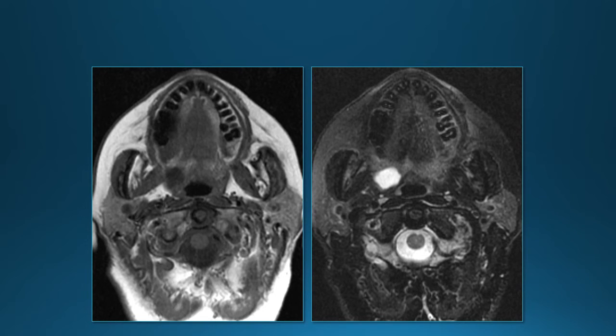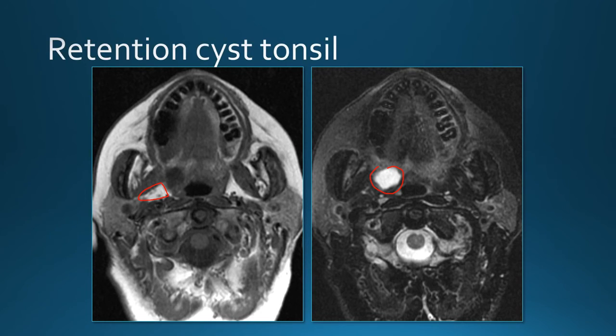This is similar with a lesion in the tonsil here. This one, the parapharyngeal fat is normal. There's no enhancement. This patient was asymptomatic, and this is just a retention cyst of the tonsil.